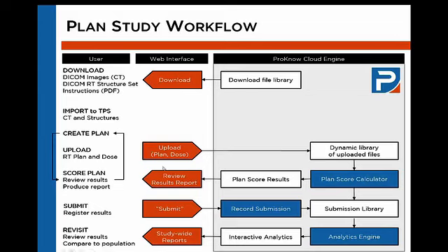When you're ready to submit that plan, then you'll see it's pretty easy. You just click Submit. You're then officially part of the plan study. Once that plan study has been presented or published, or once the plan study is closed for new submissions, you will then be able to log back in and analyze your results statistically versus your peers.